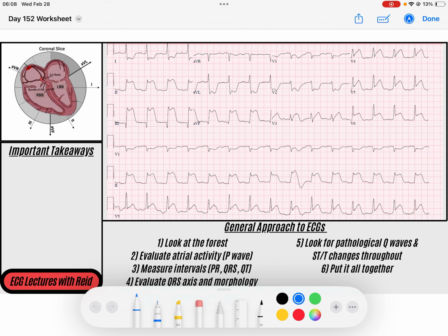This is a great example of a pretty obvious diagnosis where maybe we should just try to do our full approach and not miss anything. It doesn't mean that there's anything to miss, but we need to do our due diligence, right? We owe that to the patient. So first thing we're going to do is not look at the obvious, and we're going to do our normal thing.